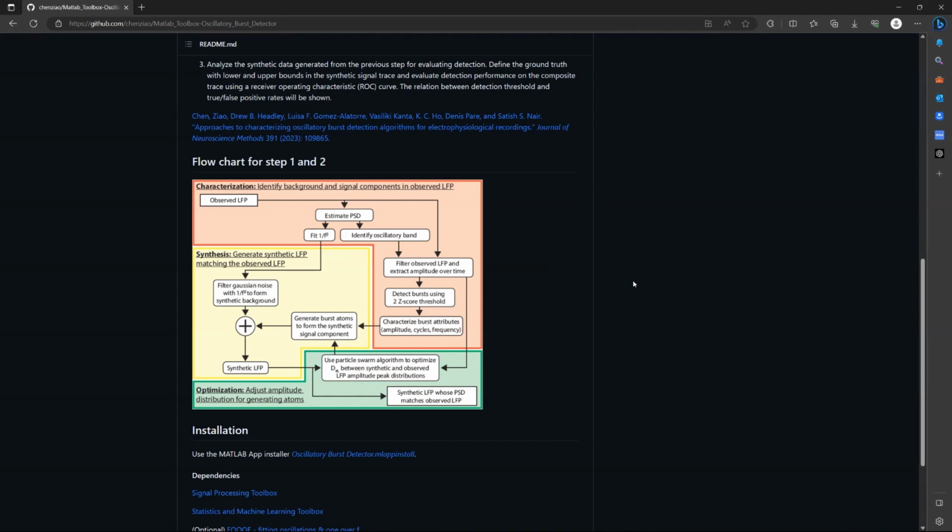We offer three candidate types of parametric distributions: gamma, log normal, and exponential. In general, the gamma distribution works well. To assess how good the fit is, we use metrics such as Kullback-Leibler divergence, or Jensen-Shannon divergence, where a lower divergence value indicates a better fit.